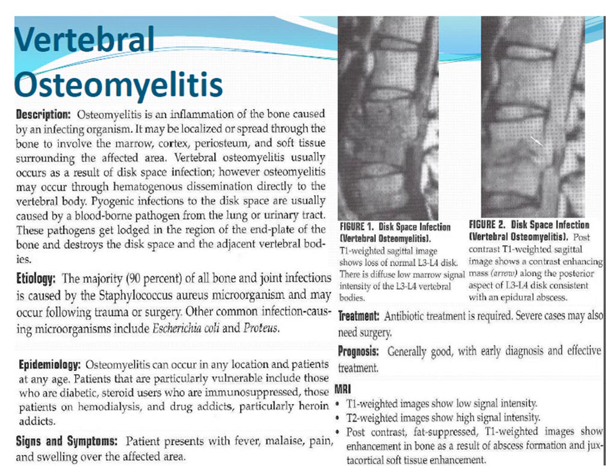Occasionally this can happen from hematogenous dissemination. If the patient has bacteremia, it can just spread to the vertebral body. But the infection really sets up very nicely in the disc and then starts to destroy the end plates around it. So what you're looking for is some really terrible, irregular-looking end plates surrounding both sides of the disc, not just on one side. And then on the T2 weighted image, which we don't have, you'll see a lot of fluid signal in the disc space.